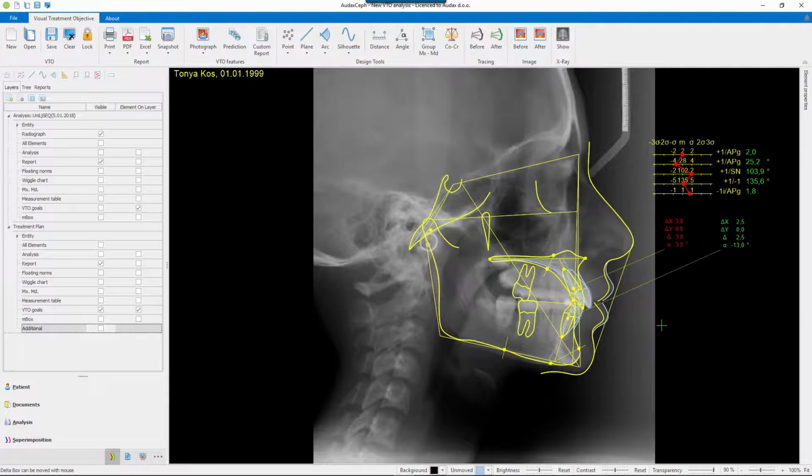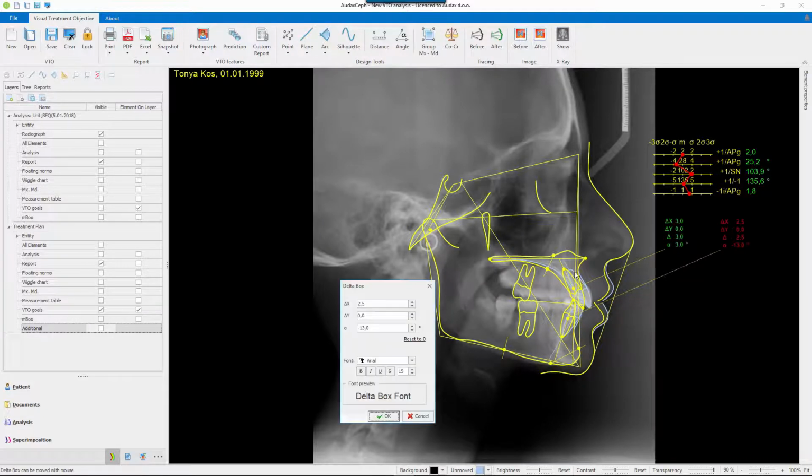It's not what I want. I just wanted to show you the mechanism. I'm not an orthodontist. I don't know whether this position is okay. Probably this teeth should go a little down. And this can be achieved, so probably something like this, and go in front, something like that.